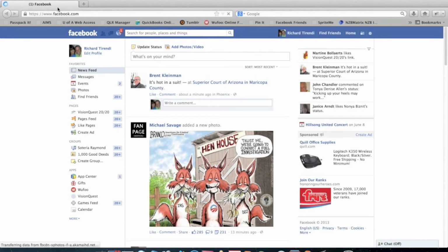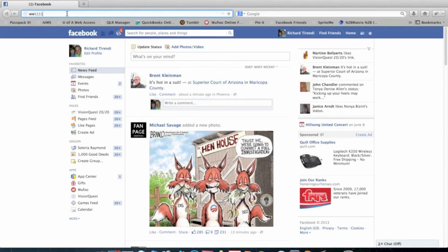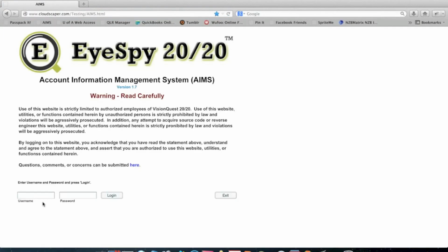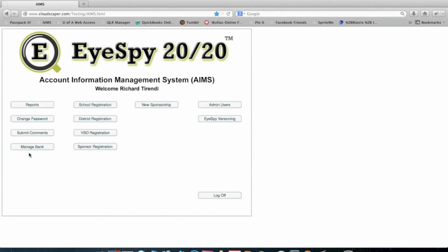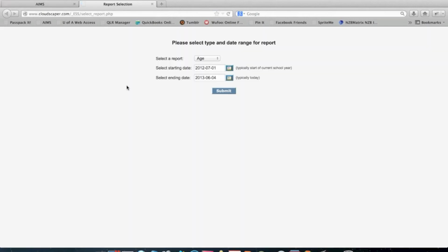As far as this web-based reporting, I'm on the Mac right now, on the Mac side. So yes, the website can be run on a Mac.